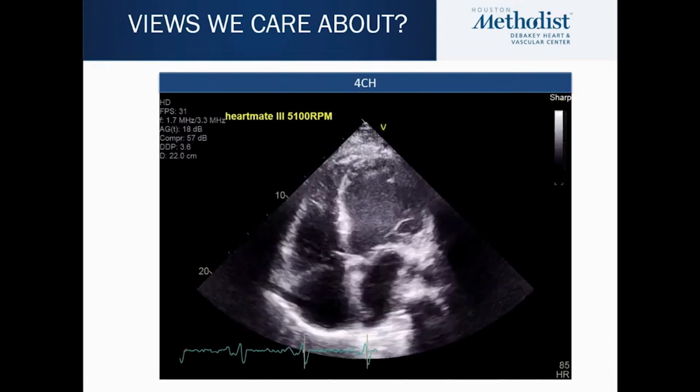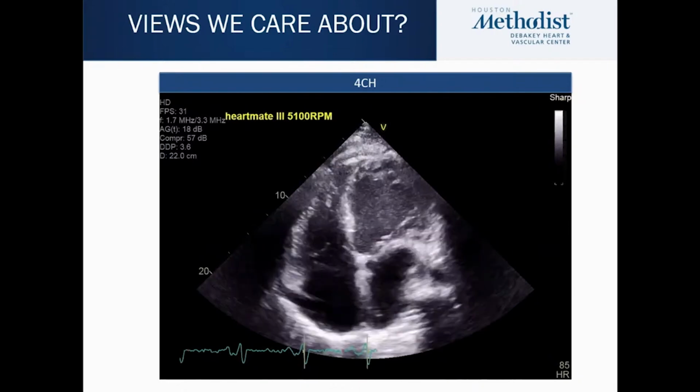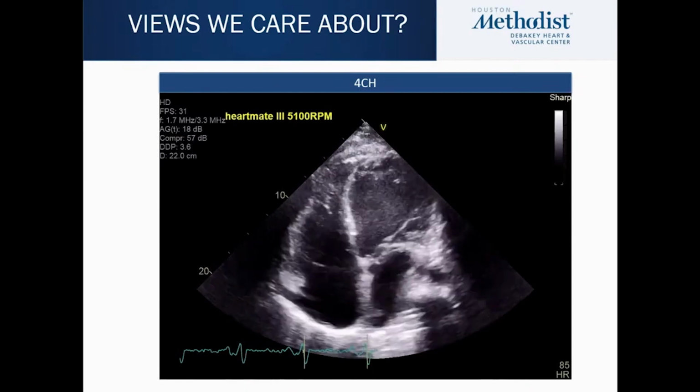Again, hard to see in this image, but the inflow cannula is something we want to visualize. And again, if we can get a good alignment in terms of Doppler, then it's beneficial and can help us in some ways. But there are no studies where there's been good alignment, and usually we don't use it clinically.